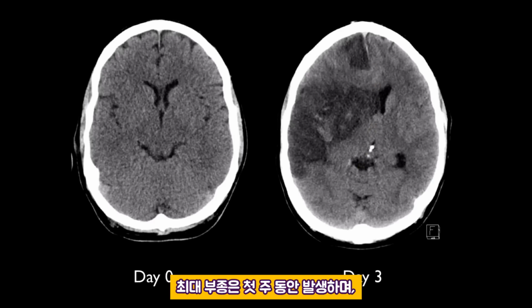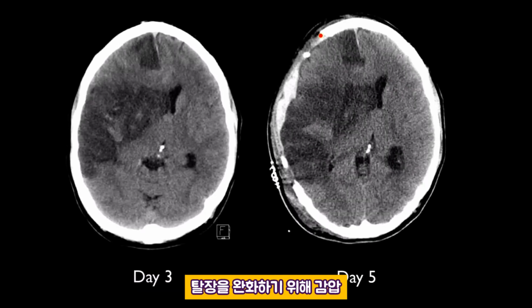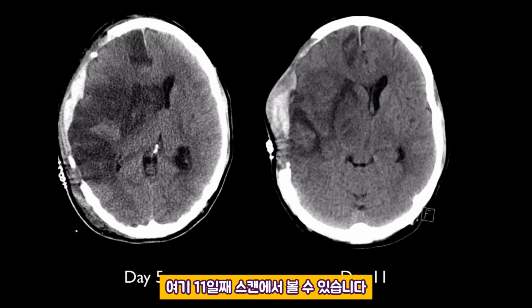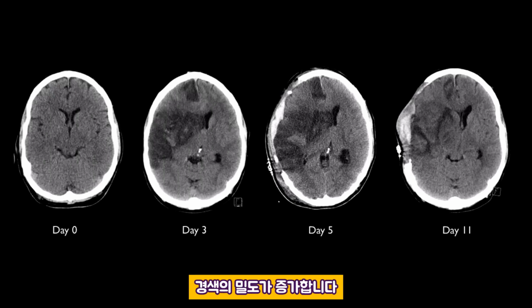Maximal swelling occurs during the first week, typically maximal at day 3 or so. In this case, swelling is so severe that a decompressive craniectomy is performed to try and alleviate raised intracranial pressure and herniation. With time, swelling starts to recede, as seen here on this day 11 scan. Note also how, with the reduced edema and associated influx of inflammatory cells histologically, the density of the infarct increases.